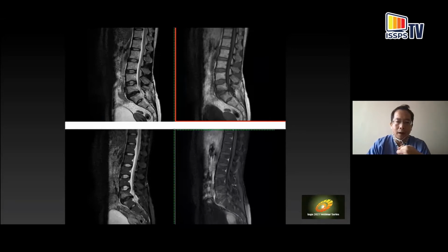It also allows us to analyze the degree of disc protrusion, and it is well contrasted against the CSF signal within the spinal canal. So then I ask you, what is this last image? The signal of the fluid is dark, but everything else looks dark. Bladder, dark, subcutaneous fat, dark, but there are these bright areas here, and these are the basivertebral veins, and these are vascular structures which are now bright. And the only way we can get that to happen is if we give them contrast. So this is a post-contrast T1 weighted fat suppressed scan.